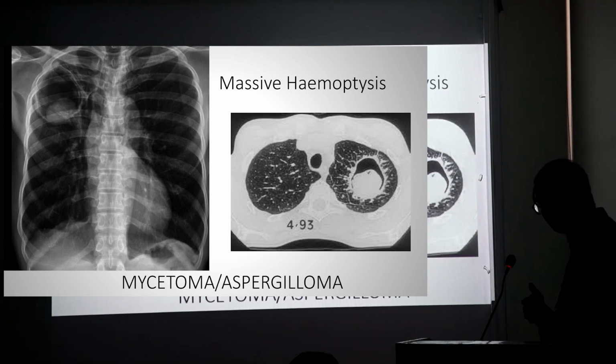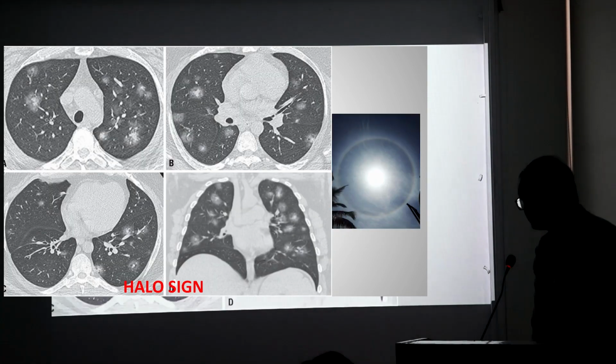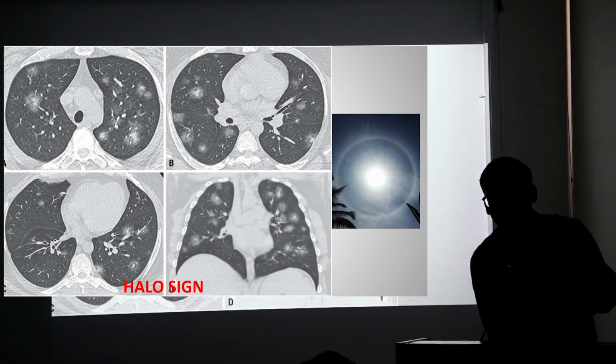We can see that if, for some reason, there is a long standing cavity, such patients can have development of these fungal balls. So these patients are very prone to having very massive hemoptysis. These patients come with massive hemoptysis to the emergency. So which sign is this?